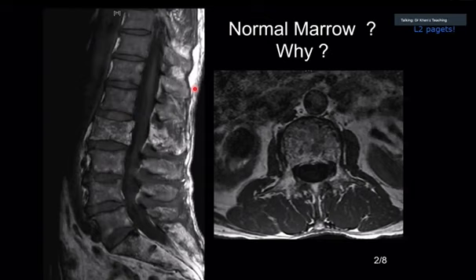But the main point here is, look at this. This is a T1 weighted sequence, and the marrow is bright. It is even brighter than the rest of the vertebrae. Yeah. Bright marrow on a T1 is good news. That's true. Right. So the learning point here is, interestingly, can you imagine they have shown MR of Paget's disease in the exam?